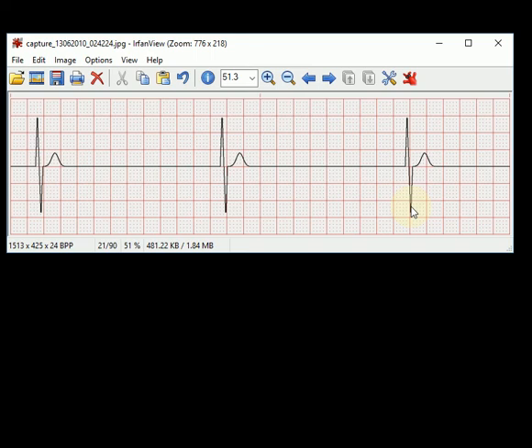Well, it can't be a sinus rhythm because it's got no P waves on here, so there's no atrial activity. And I've explained it's a narrow QRS, so it had to start above the ventricles. It's a junctional rhythm. And with the rate being 30, that's actually less than what we would expect the junction to fire. So this would be a junctional bradycardia.